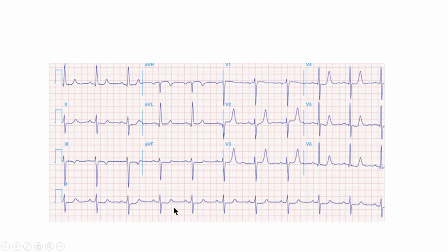The QT interval can be easily eyeballed, and if we drew a perpendicular line bisecting these two fields, it would fall right here, not on the T wave. Our QT interval appears to be normal. We have completed our intervals, so we move on to increased chamber size.